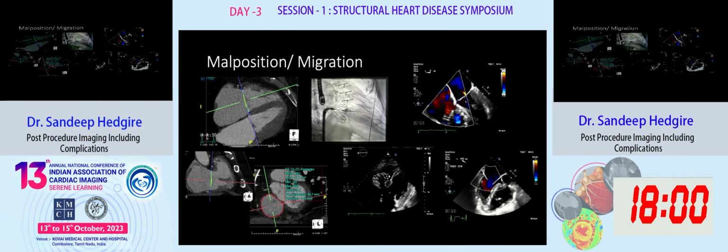All right, let's take a deep dive into some of the complications. So first case, here is a patient who has a very large tricuspid annulus. When I reported this, there was a certain sense of disbelief that there's got to be something wrong with the measurement. But I was pretty certain about my measurement, but the person didn't believe me and chose a valve of a different size.